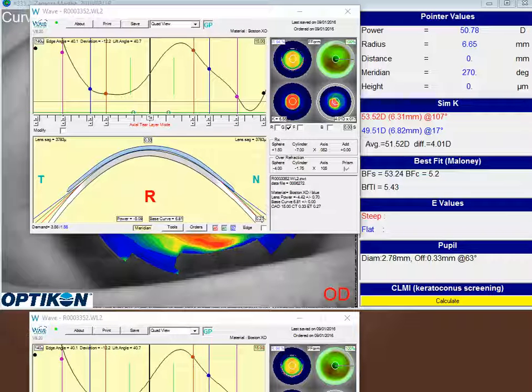I see from your clinical request in the scleral design you're struggling with limited clearance centrally and also a poor tear pump. If we look at your design, overall the design looks good, and based on the Wave representation, this lens looks like it would fit fairly well. However, as you know, clinically you're not getting any kind of clearance through here.